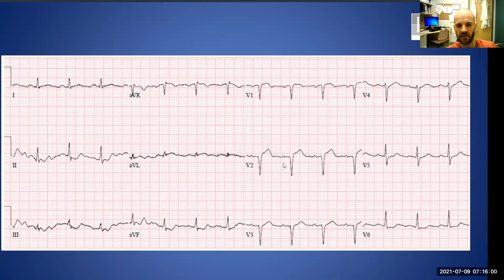If you've got Q waves, but the T waves have renormalized, that suggests that this is probably going to be pretty old. Sometimes you can get this pattern where you get some persistent ST elevation, particularly if you remember we talked about it being concave like this. Sometimes that's just a reflection of an old myocardial infarction where it always stays like this. This brings home the fact that when we're interpreting ECGs, you also need to have a chat with people to work out what's going on. And if someone says, yeah, I had a heart attack 5 years ago, but I'm feeling fine now, then that's not necessarily something acute.